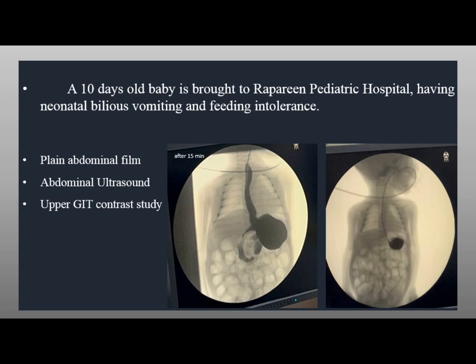We said in intestinal malrotation, the third and fourth part of the duodenum should cross the midline. This is volvulus of the stomach, gastric volvulus. It's organoaxial, which is the most common. Because this is the duodenum, and it looks good, it's not crossing the C shape, and here is the ligament of Treitz, right?